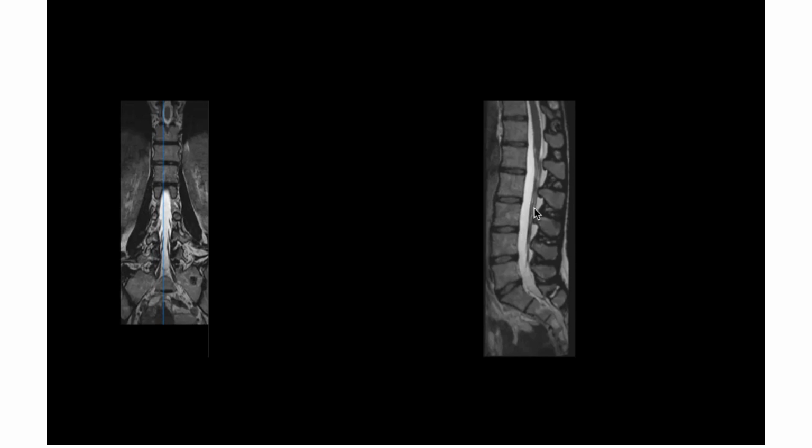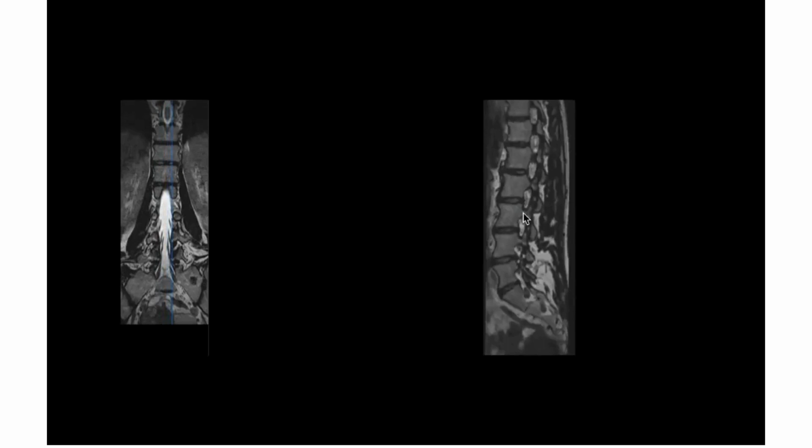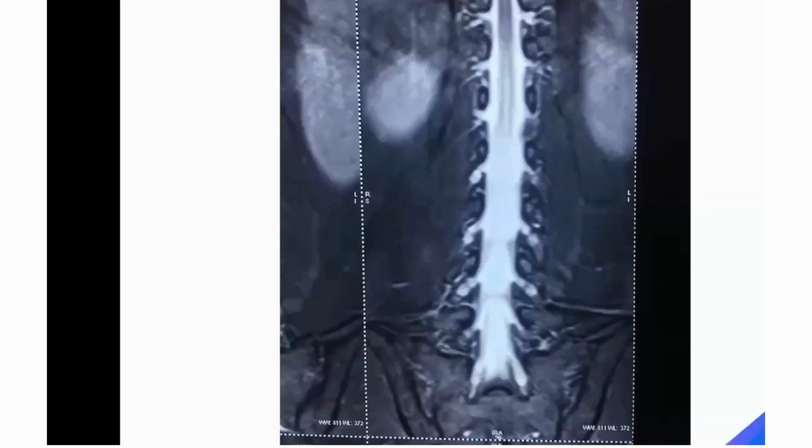Now, as you go towards the left side, you can start seeing all the separate roots again. Traversing nerve, these traversing roots. Now we go towards the foramen. Again, you can see the exiting roots. This is on the other side. Understood? This is how the nerve roots lie within the thecal sac.